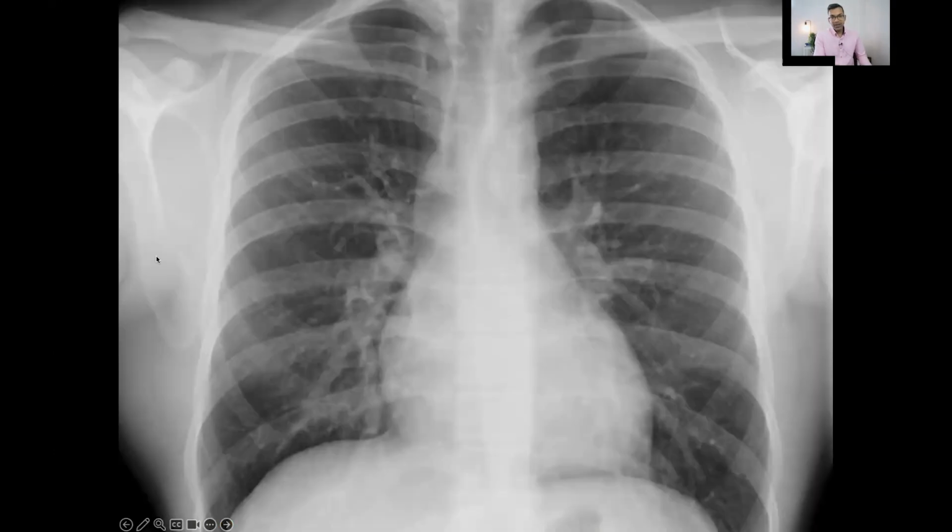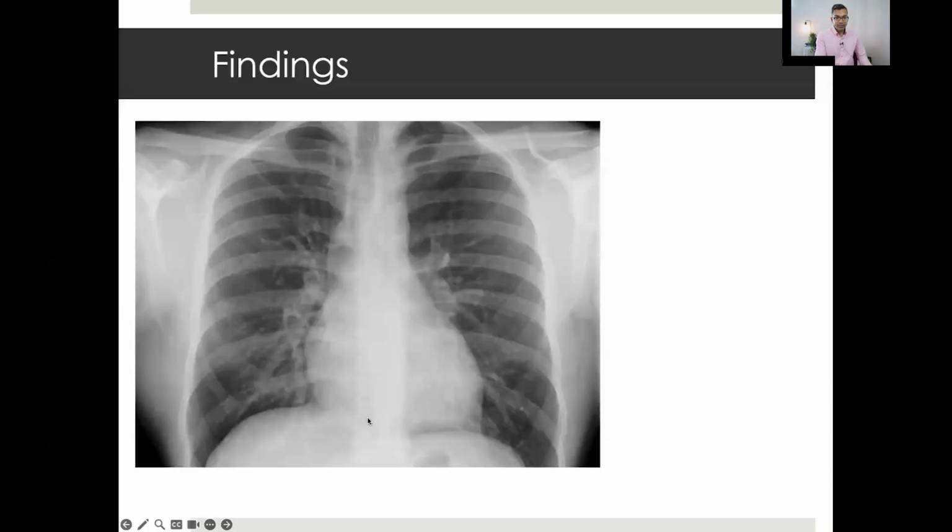And again, I hope you're getting the sense that once you've got the clinical picture, you can see that edge there. There's no edge present on the other side. It's asymmetrical. And the context means that I'm pretty safe in saying, look, I think there's a pneumothorax on the left apical side. I can see a lung marking edge here. That's the most prominent finding. Hopefully the examiner moves on. If not, I'm going to go through everything in a systematic way, but everything else looks normal.